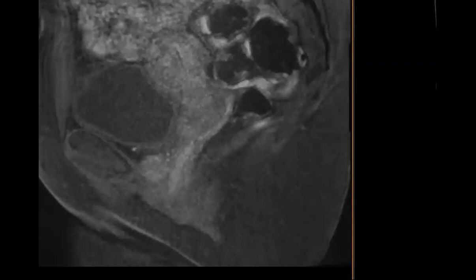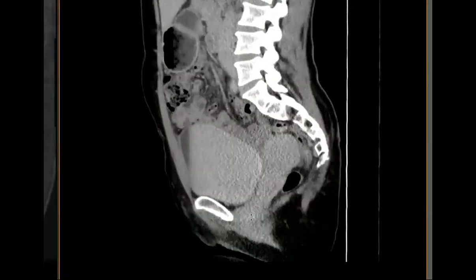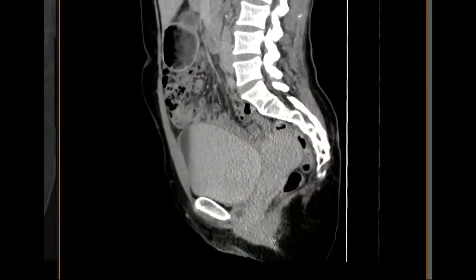Gross hematuria, do not miss this region. And we didn't have an MR here. So based on the resolution of the CT, it's hard to know if something was brewing at that time itself. It's hard to know. I do think urethral diverticula are missed on a lot of CTs, and urethral stuff in general. So it's good to just add it to your checklist. And then MR sees it much, much better.